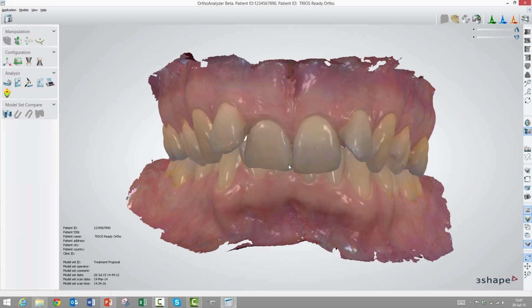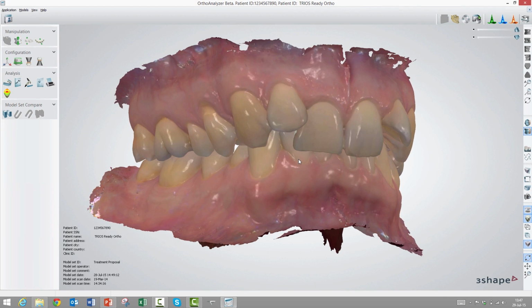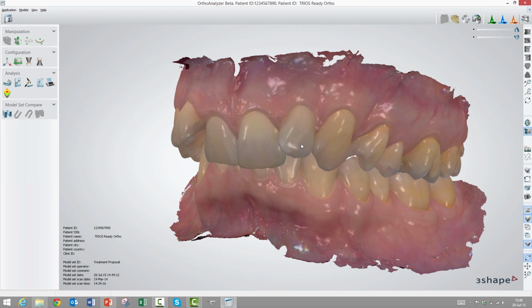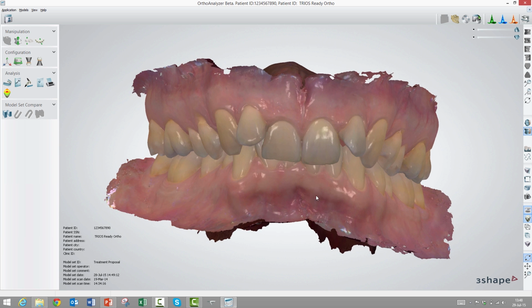So it's almost like a freaky zoom level here. It adds a real 3D perspective to the model. There are certain cases when you want to show this to a patient where this is better, but I almost never use this feature. So for now, I'll take it off, and as you can see here, it returns to normal. And as we covered the last three when we talked about the mouse, I'm actually through explaining what all these 25 tools are doing.